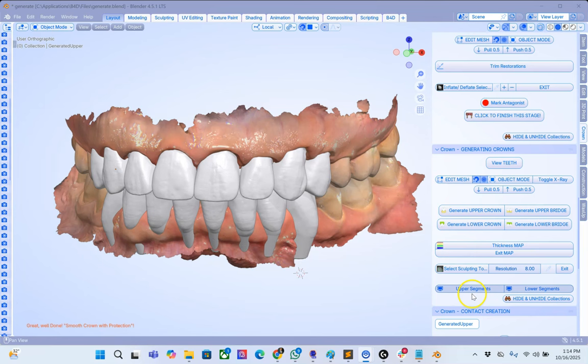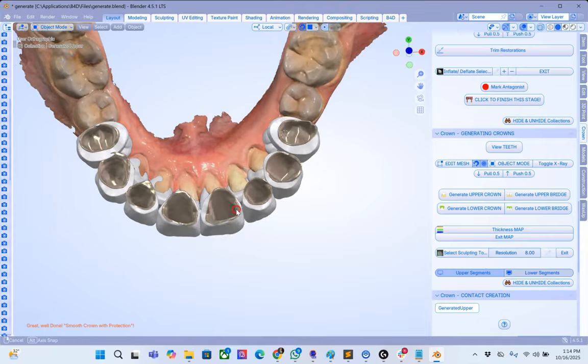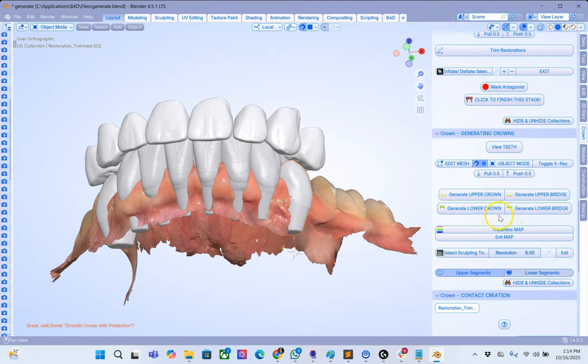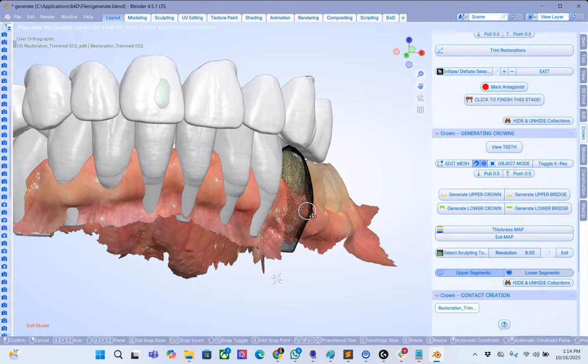Alright, the outcome seems to be perfect. Excellent. You can see the benefits of moving the teeth closer to the margin. So here we're going to do just that. I'm going to go into edit mode, and I'm going to pull this mesh a little bit closer to the margin with proportional editing on.